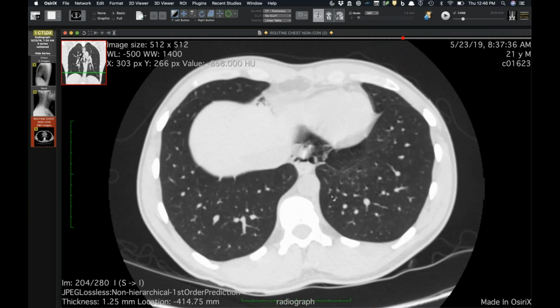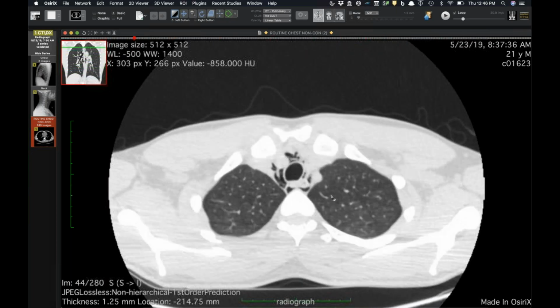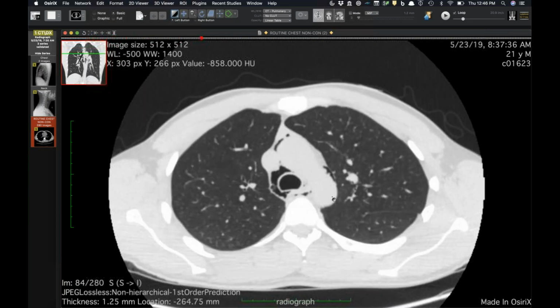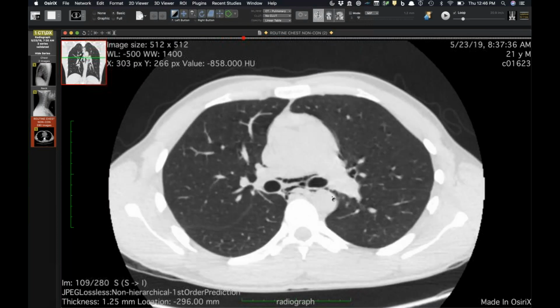Okay. Now, was there any air over the lung at the right apex? Because I thought I was seeing a little pleural line up there. No, we don't have the pseudopneumothorax. Right, the extrapleural air. Right. No. So. Okay, way cool.